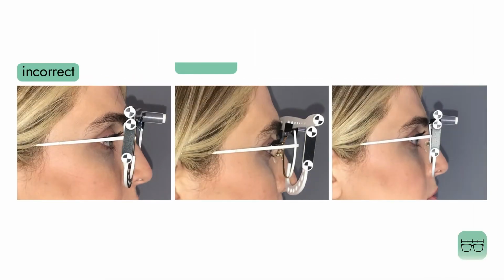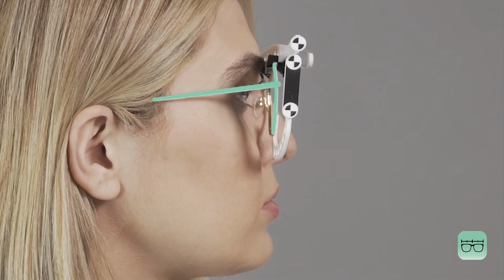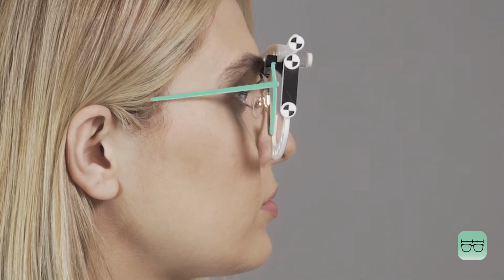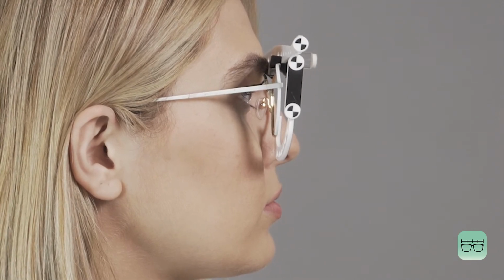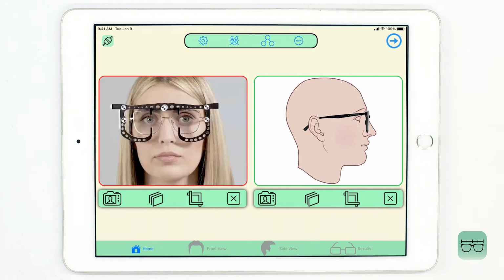In the profile photo, the outer edge of the frame should be completely visible and care should be taken not to mistake the outer edge with the inner edge of the frame. If the photo is far or small, we can resize it with the crop option.